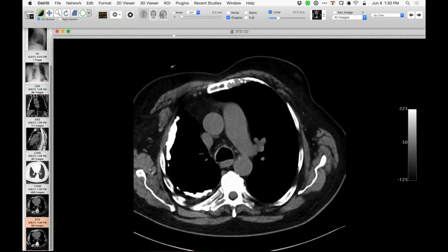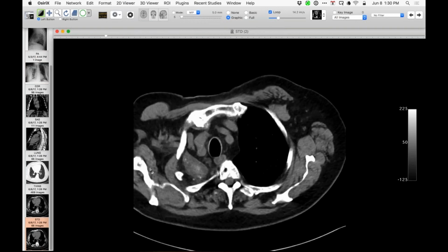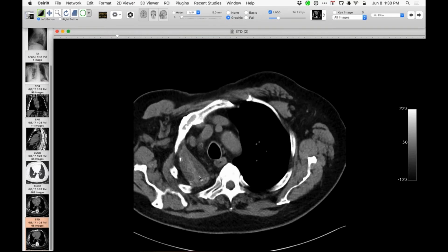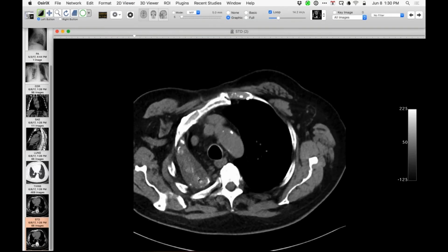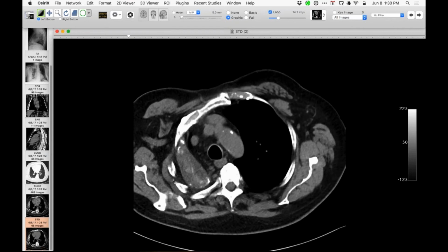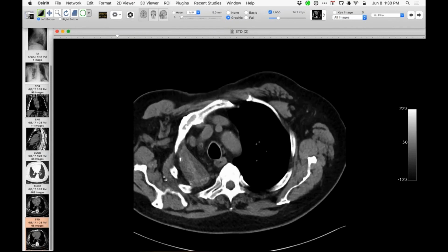I'm not quite sure why they actually got the CT, but I was intrigued by this. I don't know if or what that is, because apparently he may have had a pneumothorax treatment for the TB, and I wondered whether this is suggestive of any one thing.